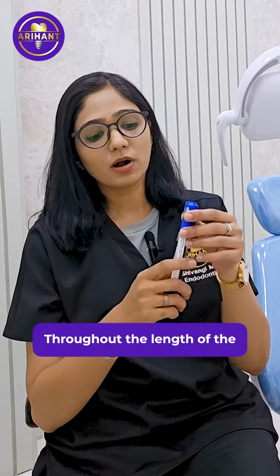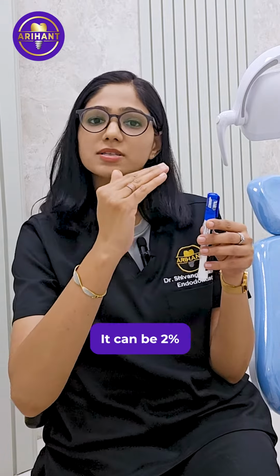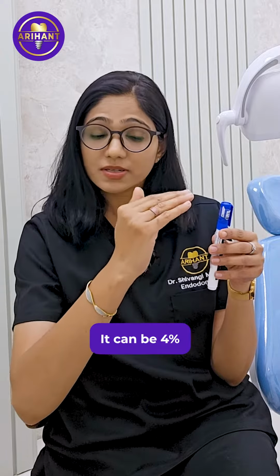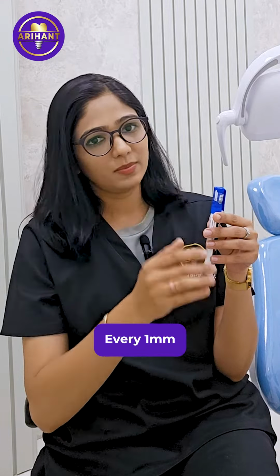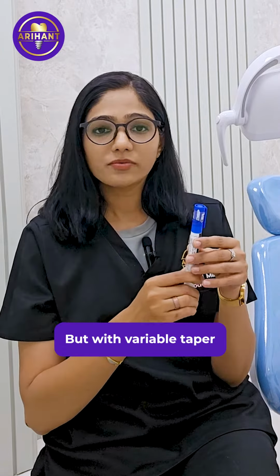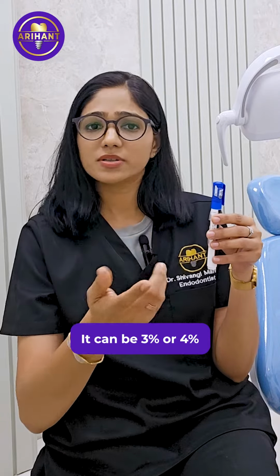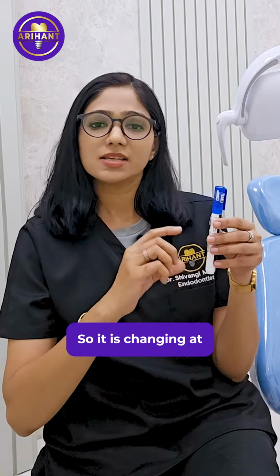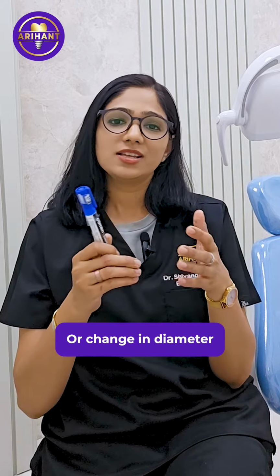Constant taper means throughout the length of the instrument or your GP, the taper is going to be constant. It can be 2% throughout the length, it can be 4% or it can be 6%, but it is going to be the same at every 1 millimeter. But with variable taper, for example, for this particular length of the instrument, it is 2%, then for this it can be 3% or 4% or whatever. So it is changing. At different lengths, the taper is different. So taper is nothing but the increase or change in diameter at every millimeter of the instrument.